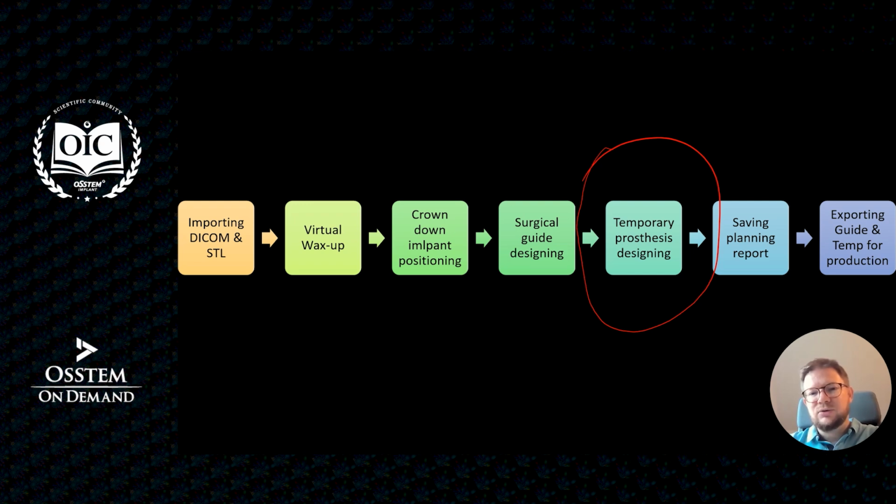However, for some patients, it's crucial to finish the surgery with immediate loading. Another step is saving the planning as a report.